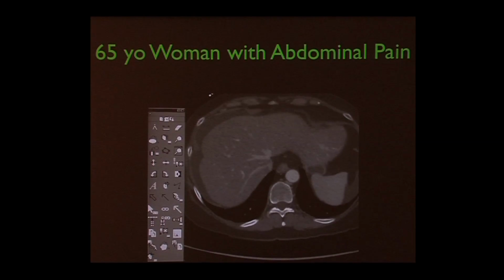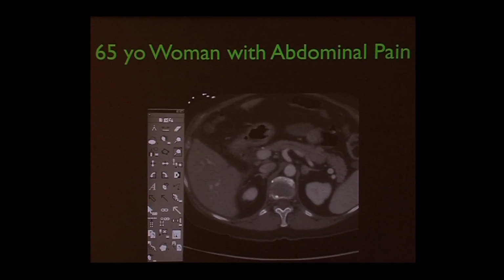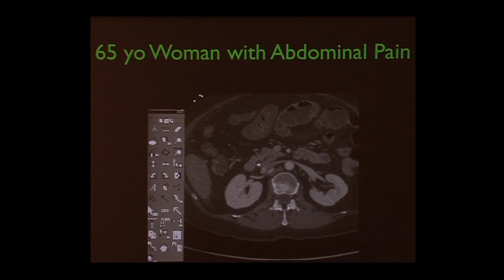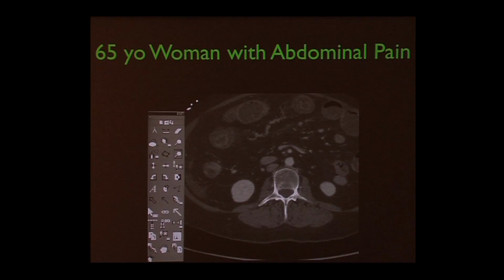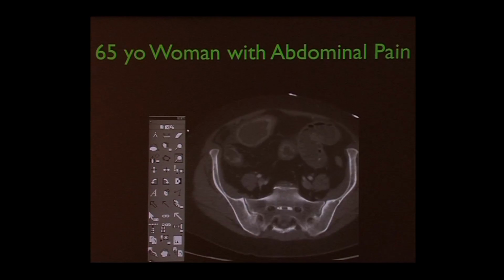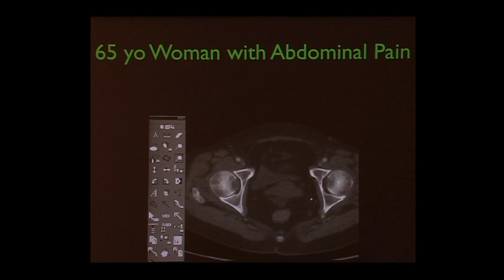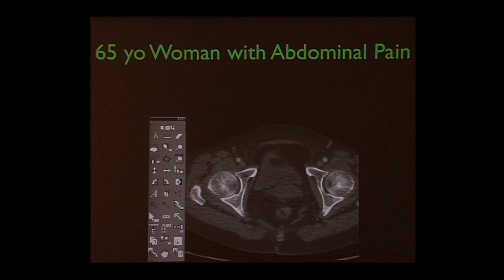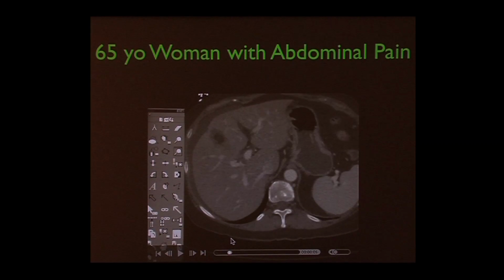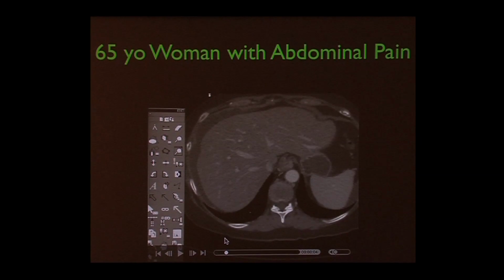So here's a movie I made with my iPhone. I tried to hold it as still as I could. So here's a scan of a patient who has pain. And I'm going through the images from her diaphragm. So this is an abdominal and pelvic CT. I'm going through, and I'm going to show you some of her findings. Anybody see any findings so far? I'll show you some still images. Maybe it'll be easier on that.